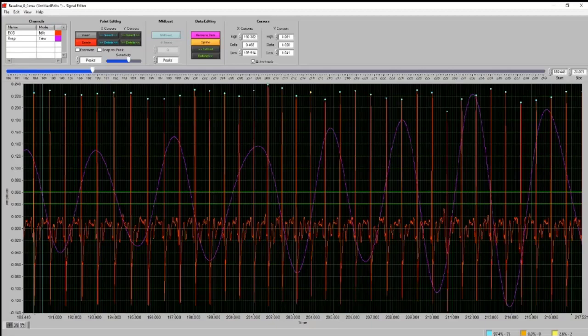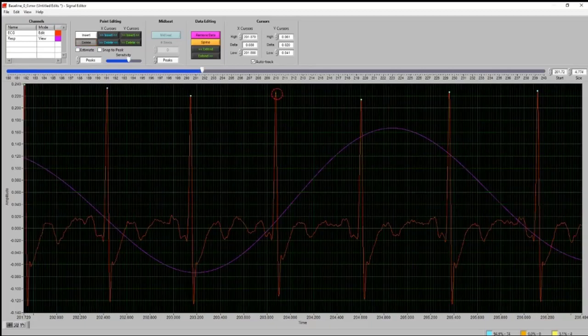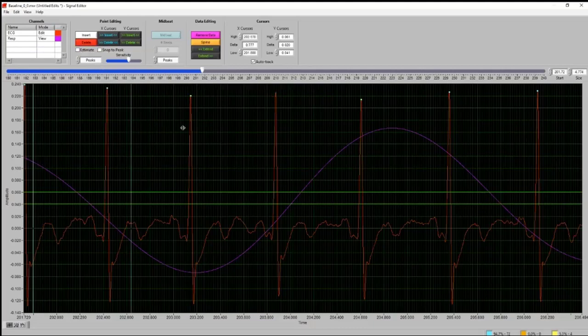So even if we were concerned about this artifact here, we certainly don't have to remove the information. We can just remove the beats, and we could mid-beat those two just to be safe. So this is also a good procedure. If one of those beats is yellow, you're not sure why, the timing's a little bit off, you've done the respiration, it doesn't seem like it's the respiration at all, any sort of questions, ambiguity, my recommendation would be to mid-beat.